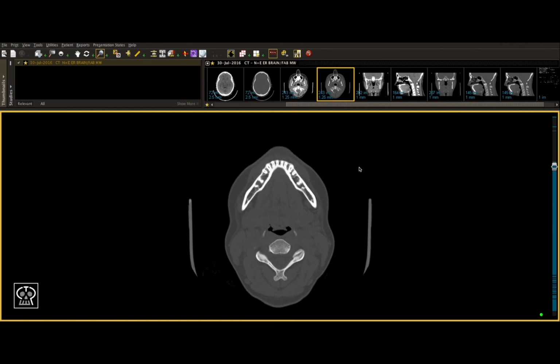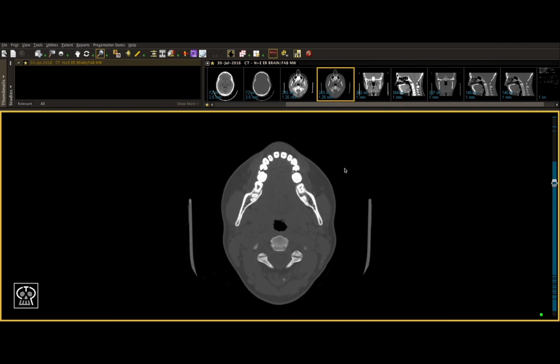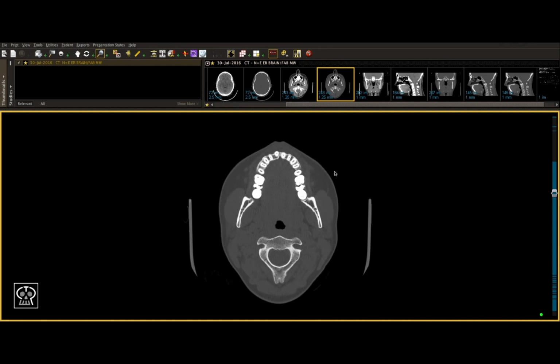Where we last left the mandible, there was a junction between the mandibular teeth and the maxillary teeth as shown here. This is where you begin your analysis of the maxilla. As you scroll up through the scan, you'll be able to analyze the maxillary teeth and their roots, and the maxilla will come into form.